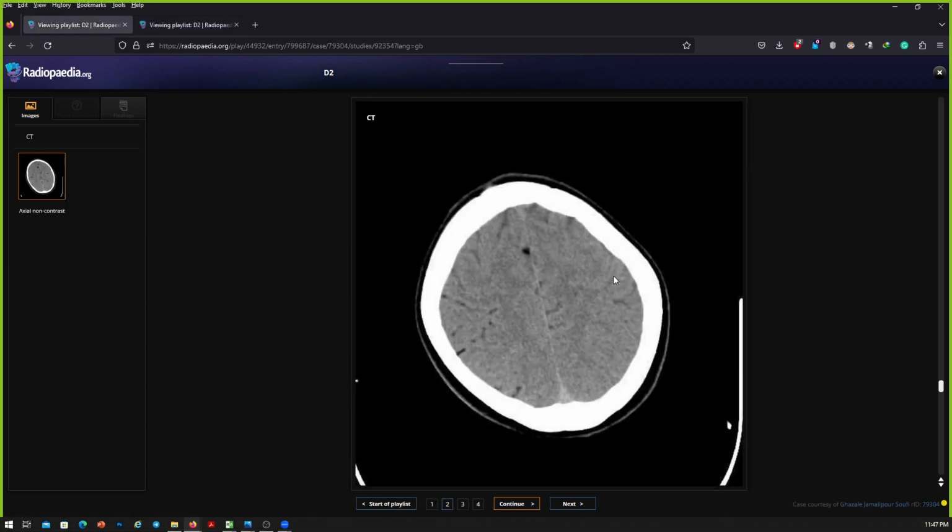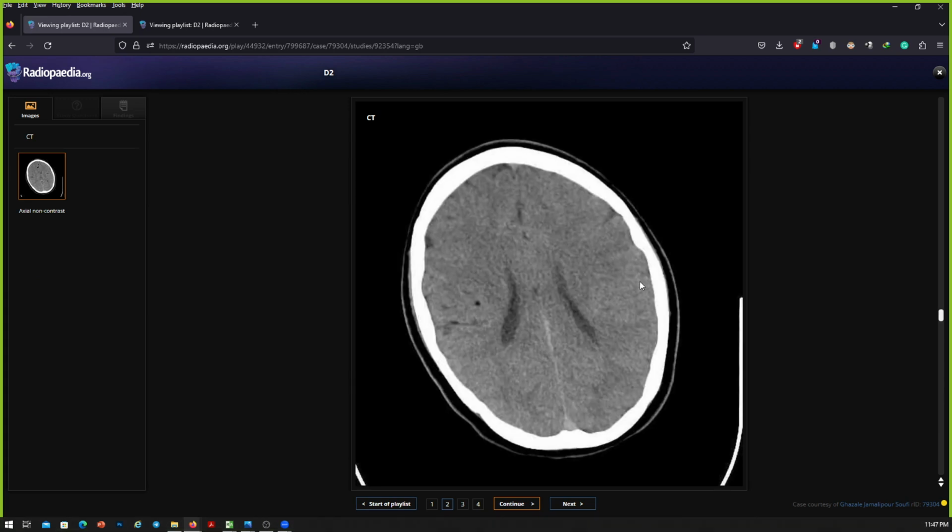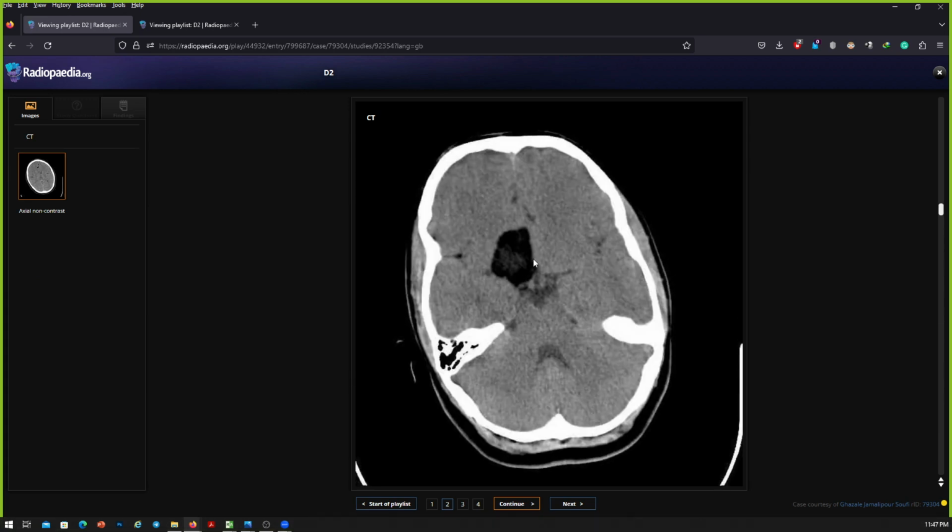This was a ruptured dermoid. Regarding the anatomy, why were you not sure which location this is in? I was confused whether this is inside the lobe. You can always say it's in the right parasagittal basifrontal region, or in the right anterior frontal region. You can just be vague about it if you don't know. It's better to be vague about it than to just tell them that you don't know where the lesion is, because that shows that you're not good at anatomy, which we all are good at, because we all passed FRCR part 1 anatomy.